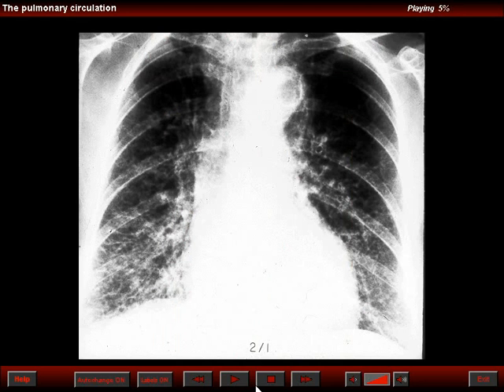In this patient with interstitial pulmonary edema, secondary to left ventricular failure, we see all the A, B, and C lines. The A lines radiate from the hila, like a sunburst. The B lines are horizontal lines in the lower portions of the lung, and they run usually perpendicular to the chest wall. And the C lines represent a reticulum due to the crisscrossing of the secondary lobules of the lung, the septa surrounding them.